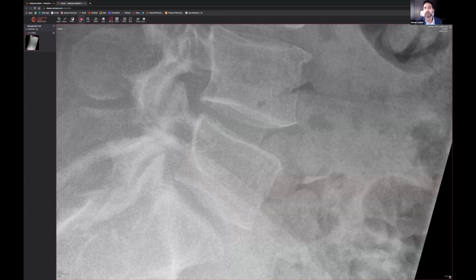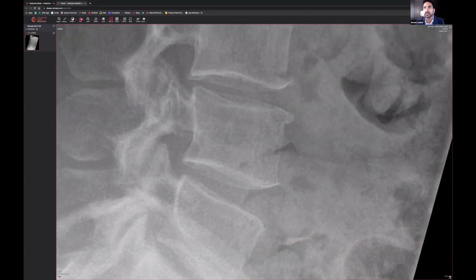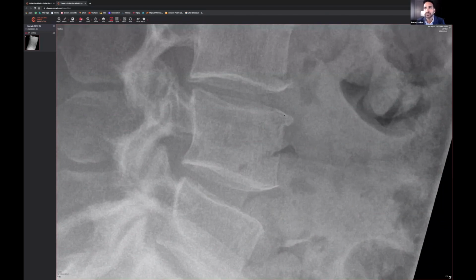And we're going to do the same thing as we go along. Next vertebra, yeah, you do have a little bit of lipping over here. You can get osteophytosis emerging from the anterior aspect of the vertebra, and that can be completely normal.